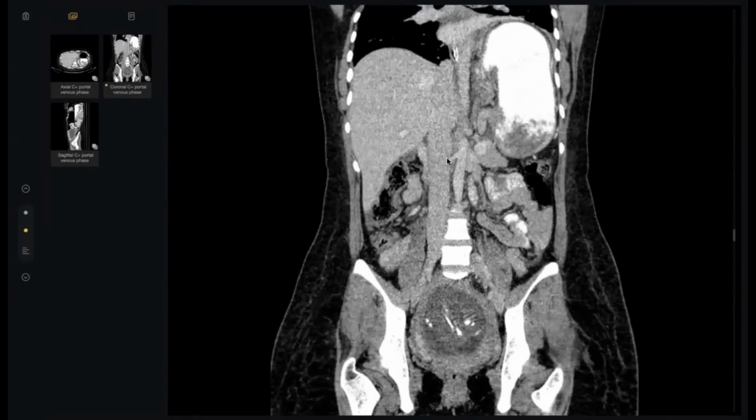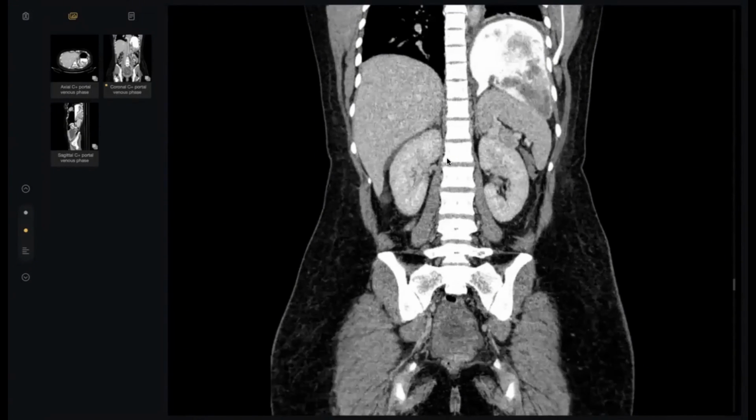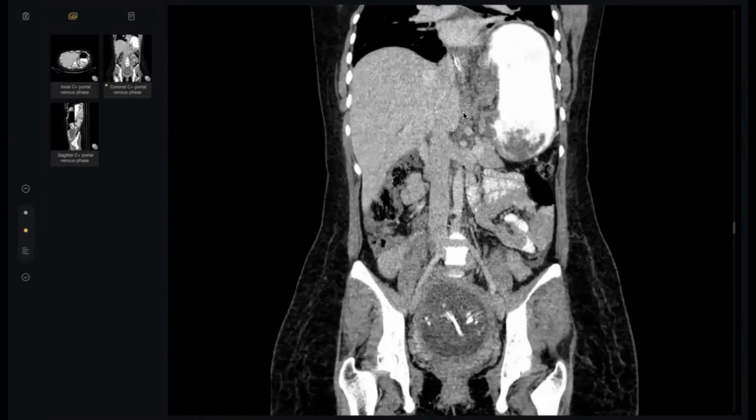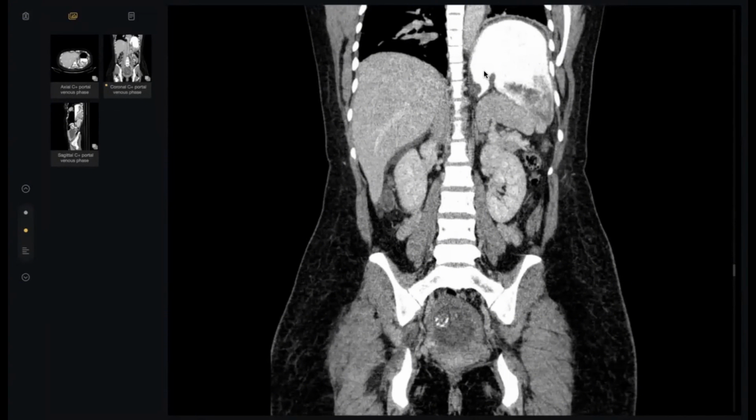One clue, and keep it in mind, is more than enough. Again, look at the gastroesophageal junction. It is in its normal position. Where is the pylorus? Above it. So this is mesenteroaxial volvulus.